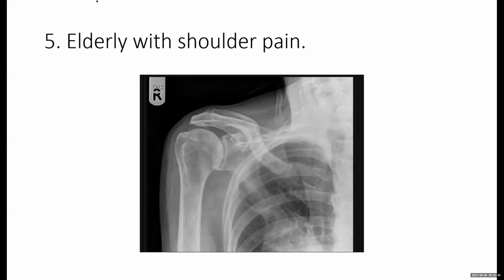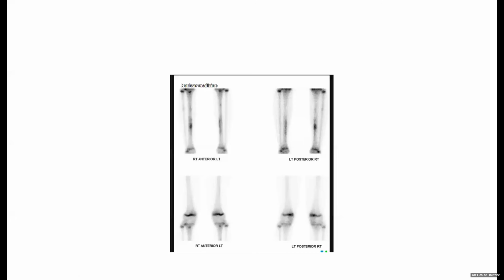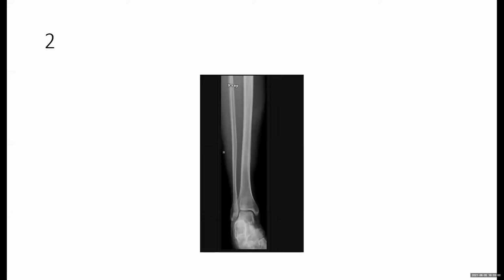And in that eosinophilic granuloma case, as Sabahat told, there is no osteoid matrix. So the eosinophilic granuloma, the Ewing sarcoma and the osteomyelitis come first. All the others are seconds and will come later. We should not say osteosarcoma here, no? The age group is not fitting, and the osteoid matrix is not there.